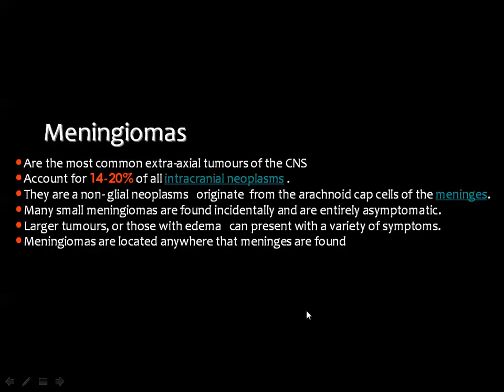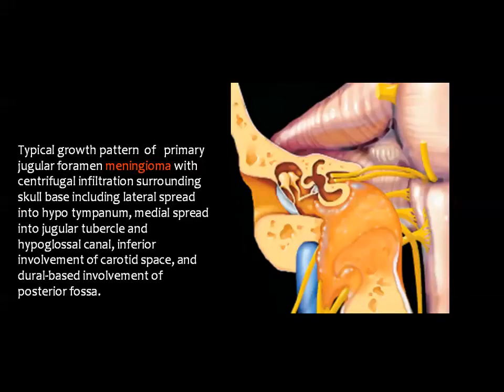As we have mentioned, meningiomas occur anywhere in the skull base, in the anterior, middle and posterior skull base. It accounts for 14 to 20% of all intracranial neoplasms, and meningioma anywhere will show the same features of meningiomas, including homogeneous enhancement, presence of calcium, the dural tail, the signal behavior like any other meningioma, the CSF cleft sign and most of the criteria of meningiomas.